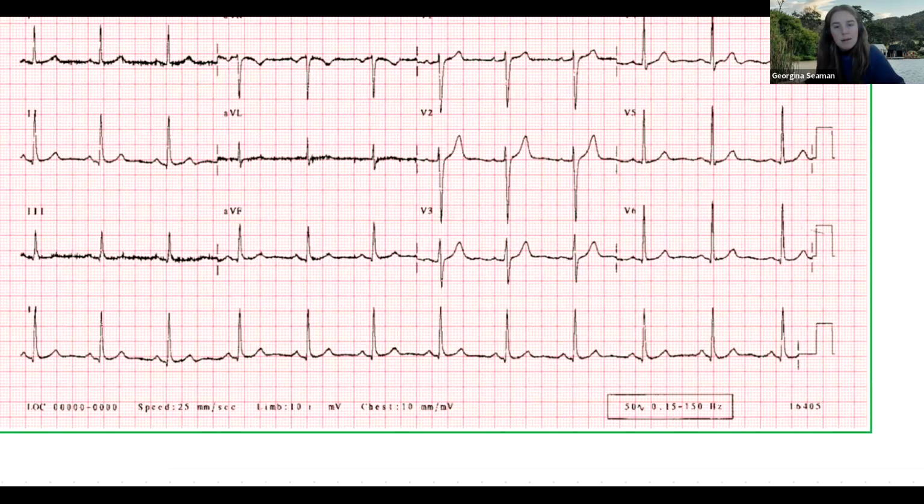Yeah, so it sounds like the average of the frequency that it measures, so how sensitive it is. But yes, to Emma's point, we should start at 0.05. So realistically, this is probably not a great tracing for us to use because of that. Other elements, if we were to ignore the frequency for now, what about our electrode placement?